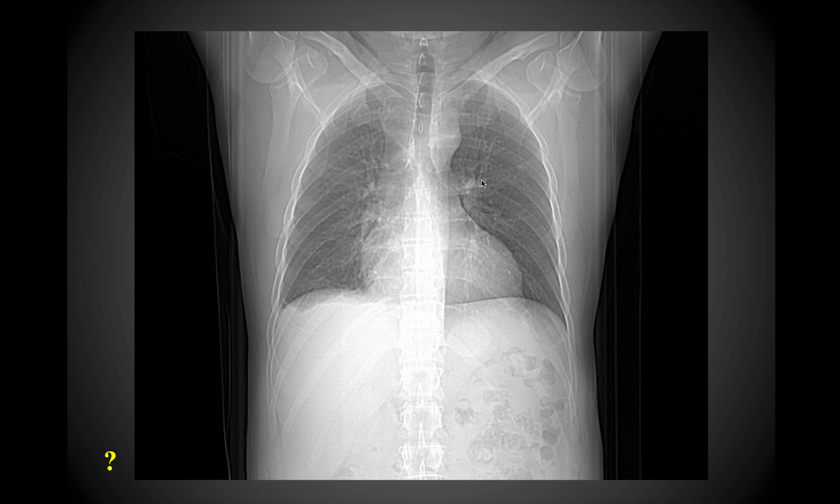Here's another example of a pathologic condition. So again, I'll give you just a moment to look at this image here and see if you notice anything abnormal. And so again, you want to make sure that you do a systematic review, so pause it if you need a little bit more time to look at it to see if you can identify anything that's abnormal. Again, appreciate your normal anatomy and look for what the normal anatomy should look like.